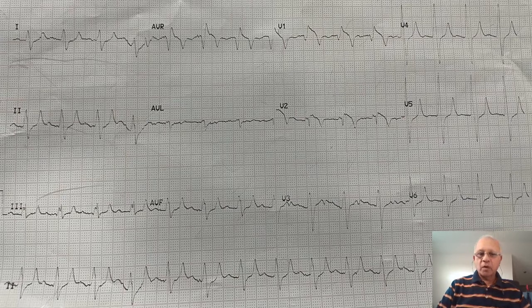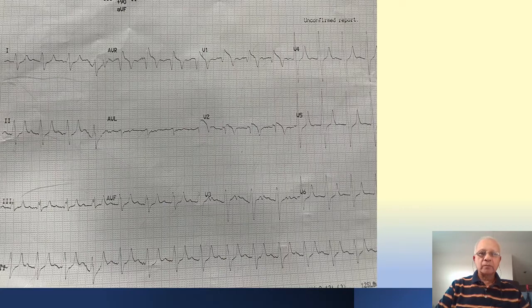So friends, we'll go on to the answers to this quiz. What are the findings? I'm sure you would have interpreted this. One, if you look carefully here, you can see a prolongation of the PR interval, right? It is about 7 millimeters, which works out to 280 milliseconds. The heart rate calculated from below is around 100 beats per minute.